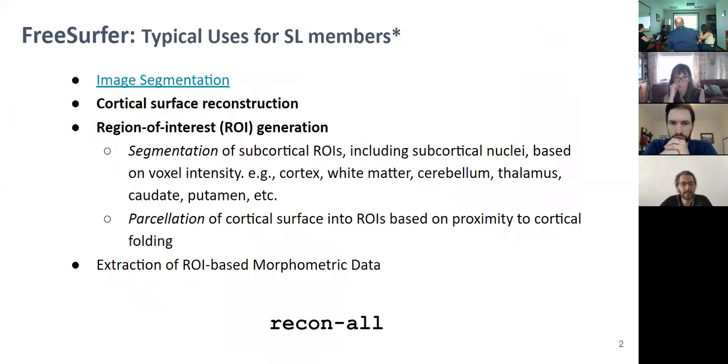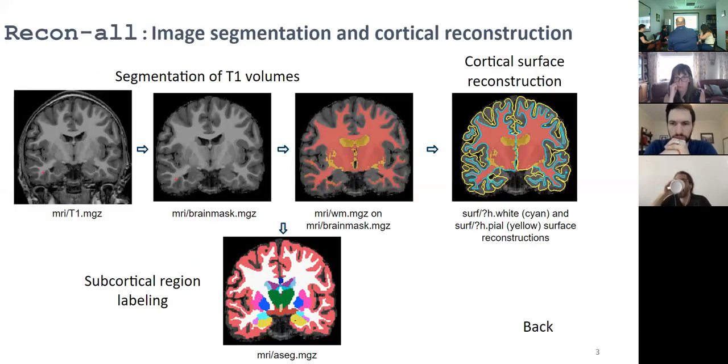We use the subcortical ROIs, but of course we also use cortical ROIs. We divvy up the cortex based on this labeling scheme that is tailored for speech studies. So we divide the ventral motor and premotor cortex from the dorsal premotor, the areas that are more involved in speech, from the areas that are more involved in moving your fingers and your arm, that sort of thing.